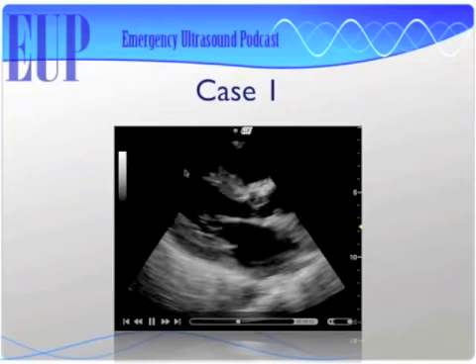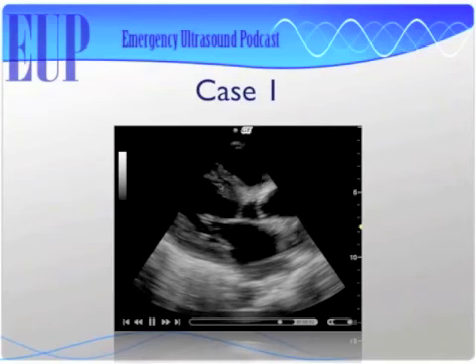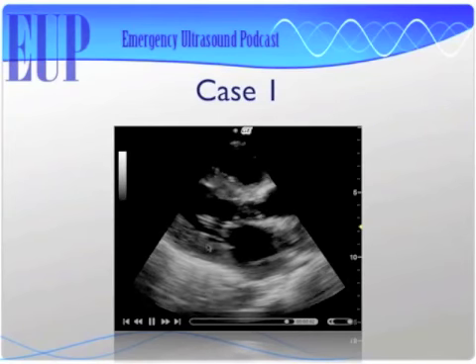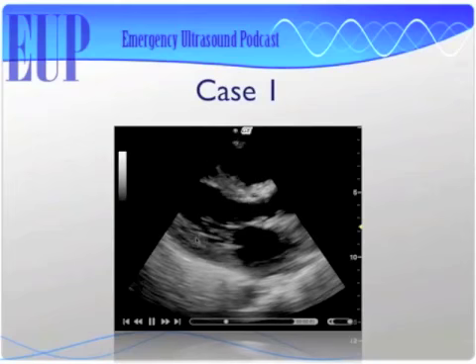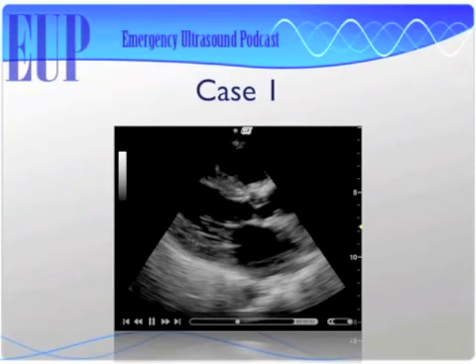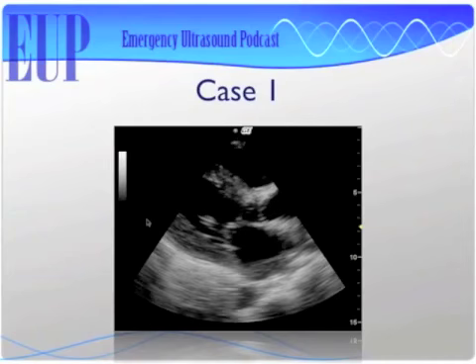Nice. I like it when you start throwing coronary arteries at me. So yeah, I agree. The LAD distribution here looks like it's squeezing, it's moving. There's some function there. This looks funky. Not only does it look a little thick, but it also looks like it's not really doing anything at all. It's not moving. So this is what coronary artery? RCA. Sometimes RCA. It's usually circumflex. Yes. Exactly.